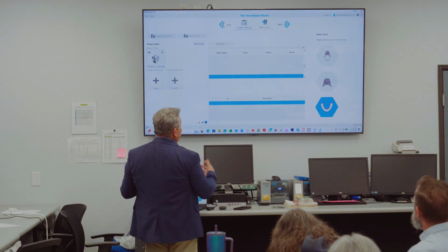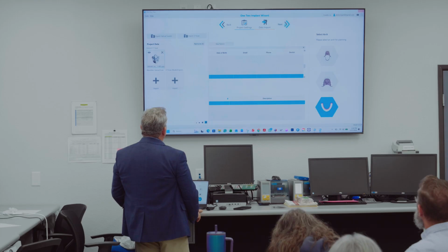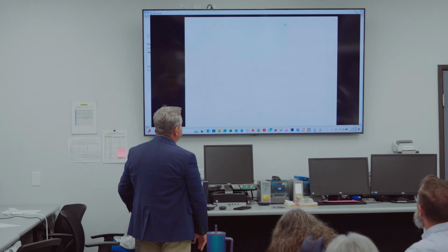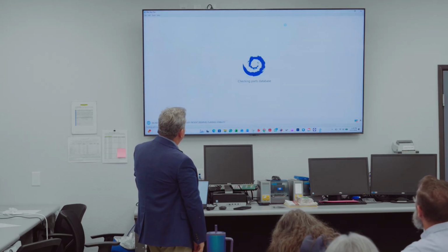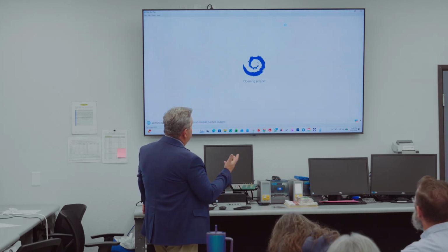And again, depending on your computer speed, this could take a little bit of time, but it shouldn't take too long. Okay, now it's bringing that in. So the next thing we're going to do is upload the STL.